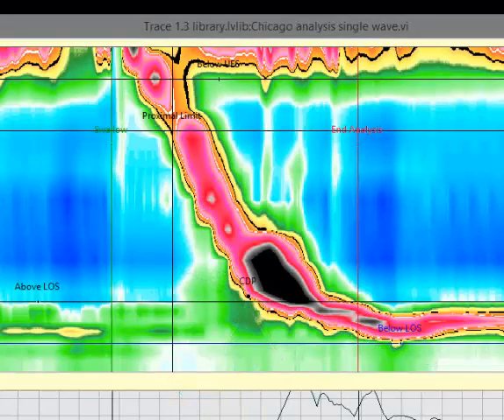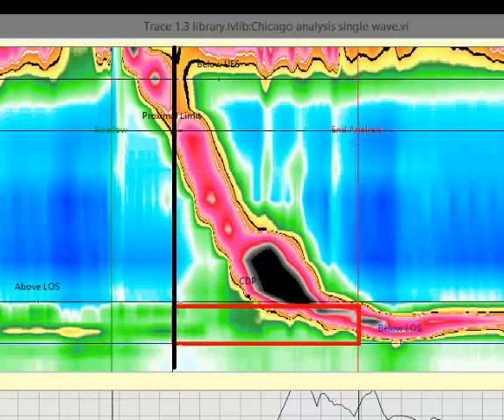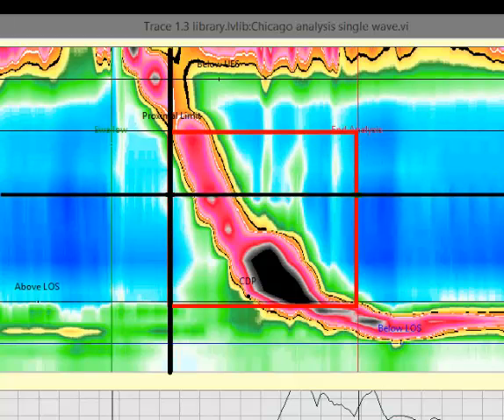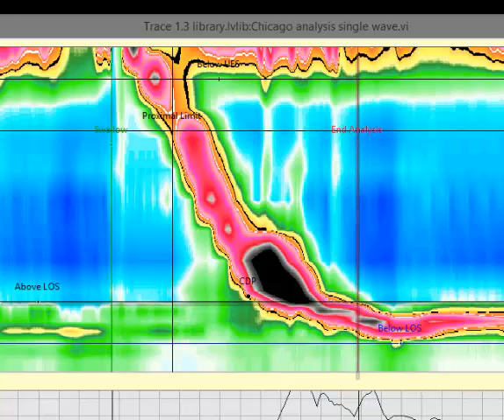The IRP will be measured between the above LES and below LES cursors from the swallow cursor to the end analysis cursor. The DCI will be measured between the proximal limit cursor, the above LES cursor, and the end analysis cursor. The distal latency will be measured as the time between the swallow cursor and the CDP. The contraction front velocity will be measured as the slope of the line between the proximal limit and CDP cursors.